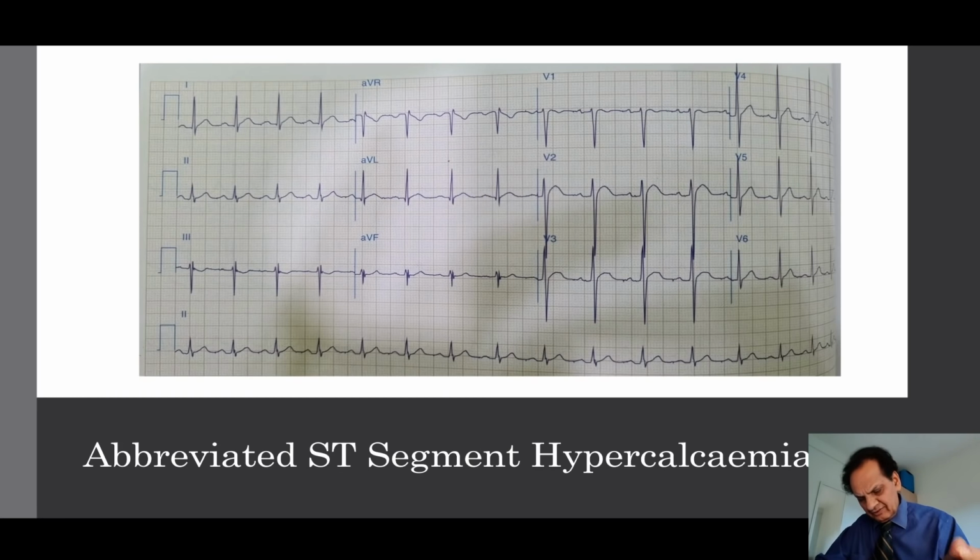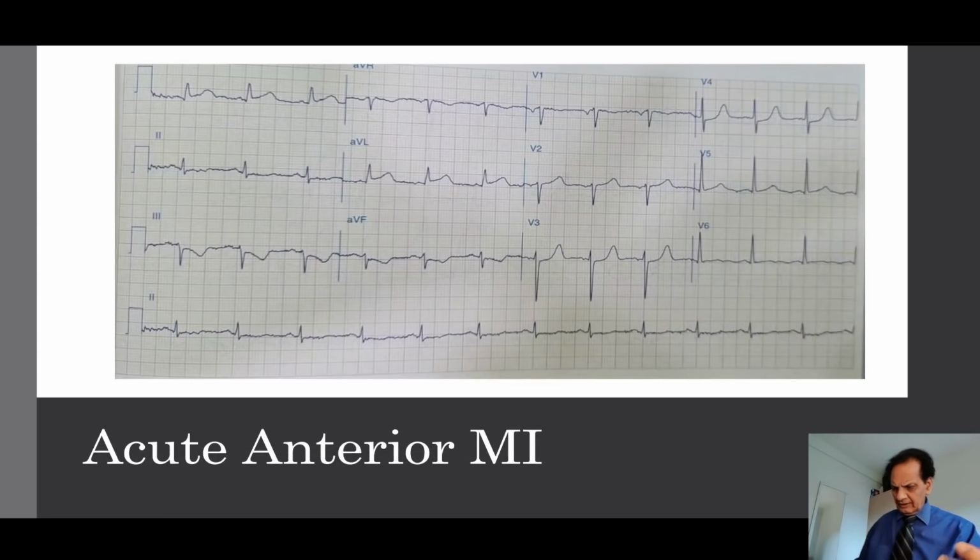Hypercalcemia doesn't have an ST segment, I should say. The whole of the ST segment is abbreviated just after the S wave. There is no ST and there is a T wave. Very good ECG, you should keep it in mind. Hypercalcemia may be associated with hyperkalemia also. We will show an ECG picture later on.